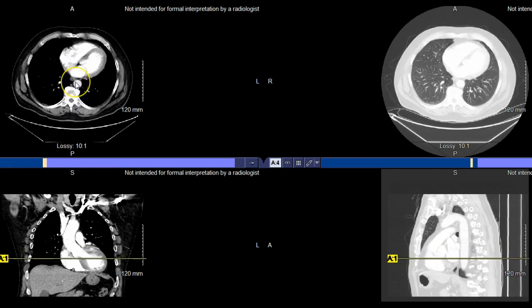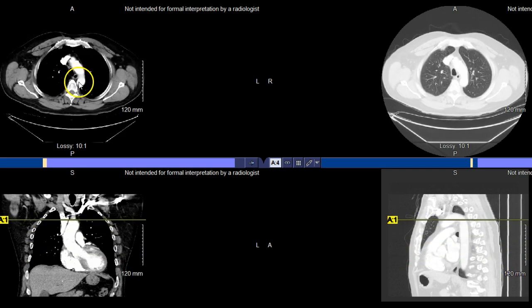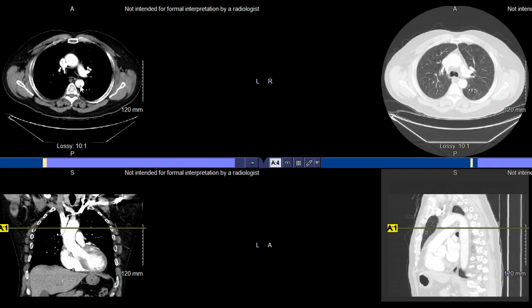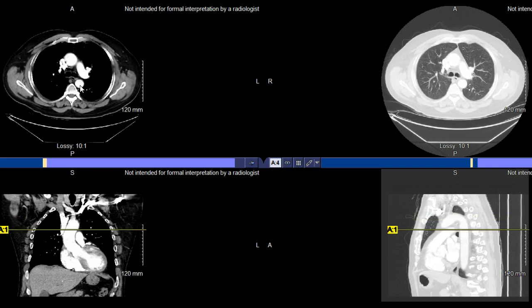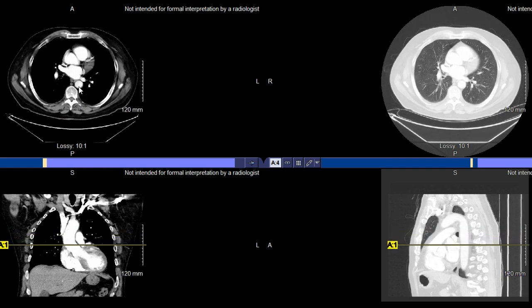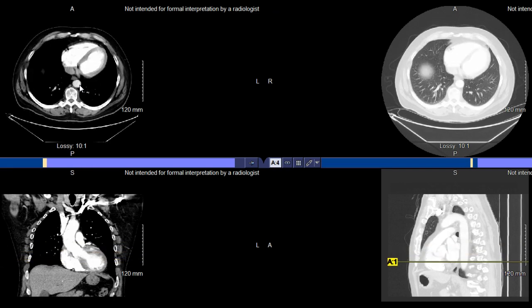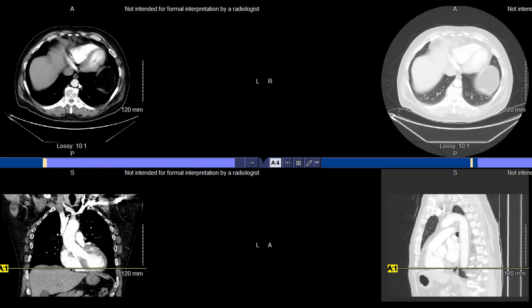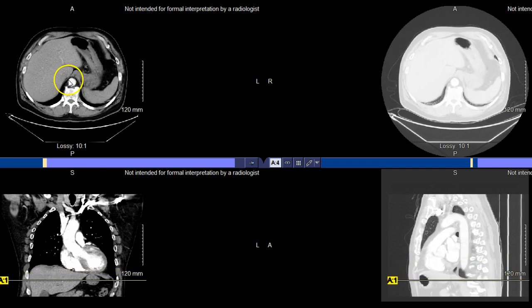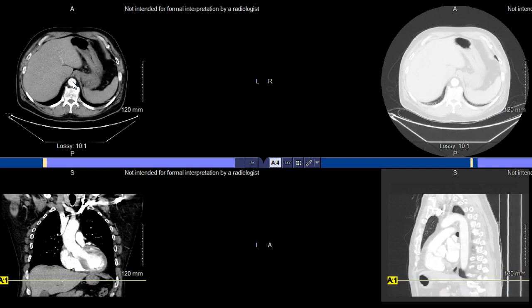Other structures, yes, we can follow the descending aorta. So I'll go back to that point, that aortic arch, and follow that descending aorta down. And you can see it's somewhat midline, but it's not a true midline structure in that it's not even with the sternum and even with the spinal cord, but it's left of those regions. So we can see that structure as it goes down. And we'll be able to even see as it trails into the abdominal region, becoming what we classically refer to as the abdominal aorta as it moves down. So you can see what that structure subsequently looks like.